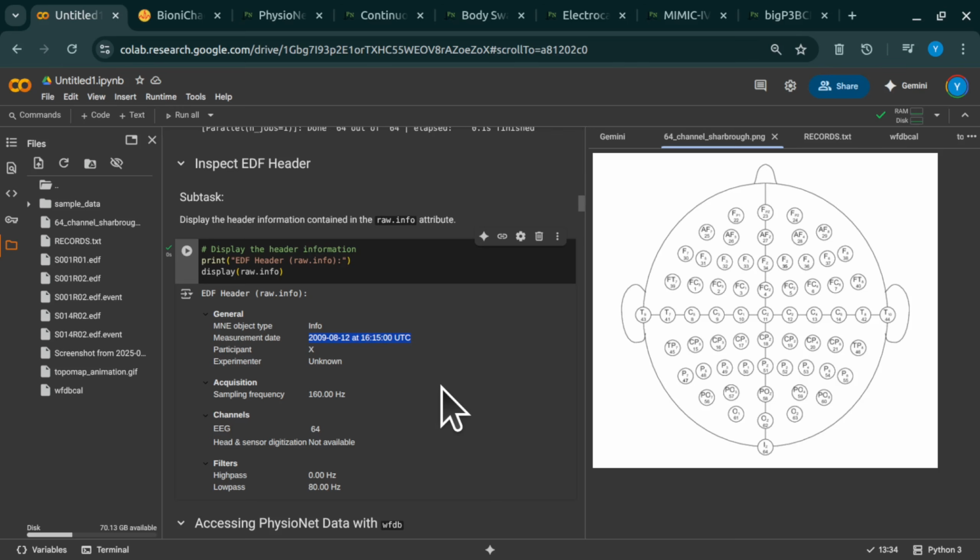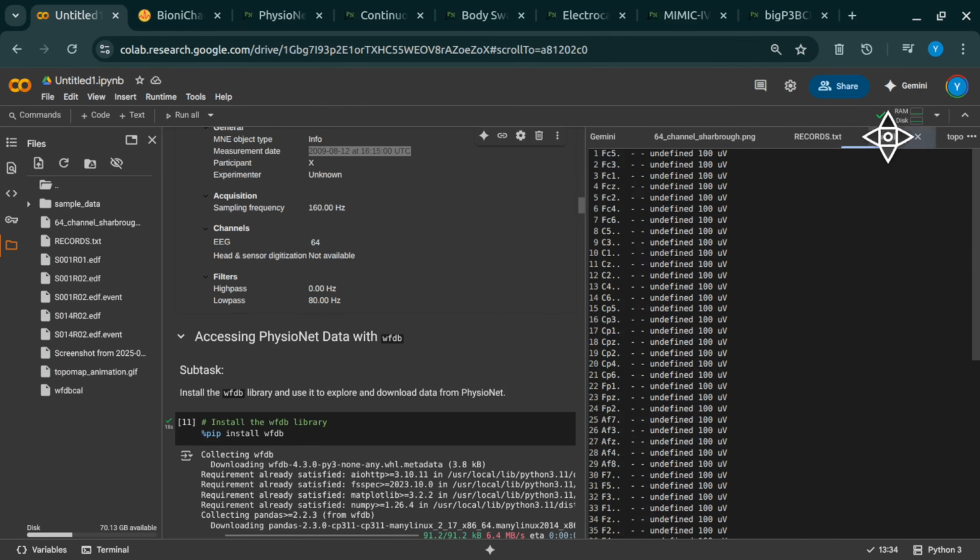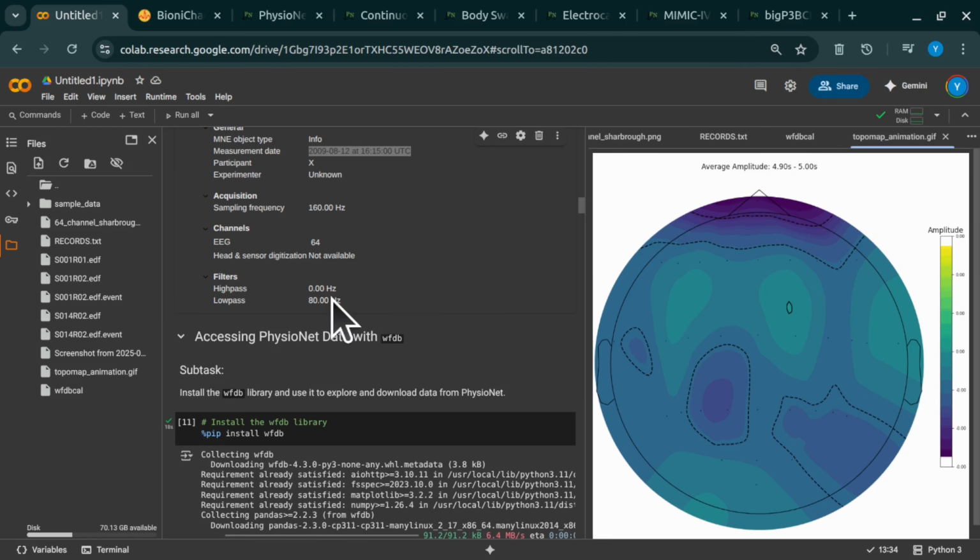That's why the next step, preprocessing, is so critical. Yeah. Cleaning up the noise. Right, got to get rid of the static. How do you do that? Well, one of the first big steps is applying a filter. We use what's called a bandpass filter, specifically letting frequencies between 1 and 40 hertz pass through.